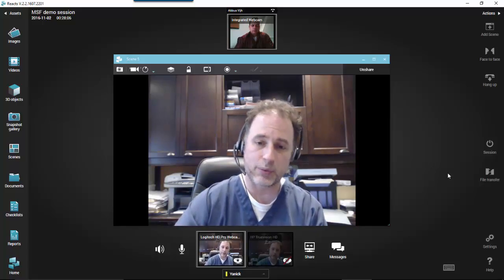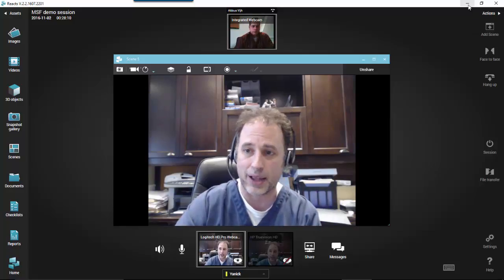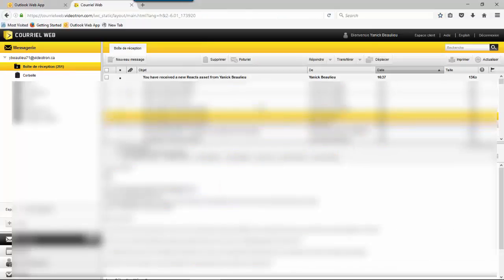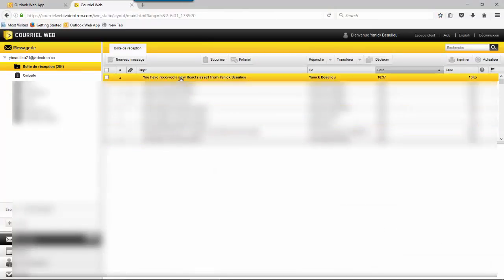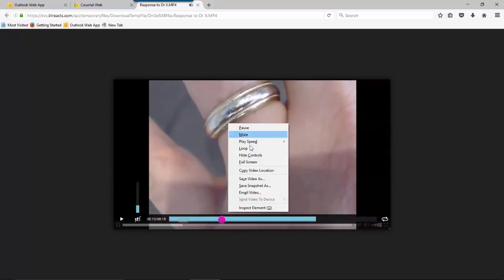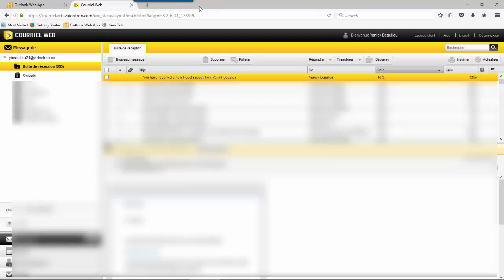Before concluding, I'm going to show you, remember I sent myself 2 things by email. So if I go into my email account, I'm going to see here you have received 1 new Reacts asset. And this here is the video I sent initially. So this is where the person can open and see the video right away. And by doing right click, they can save the video. So it takes 2 seconds and they receive it in their mailbox.